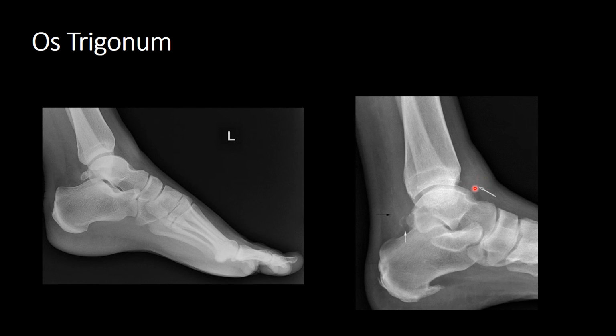This arrow is pointing to the joint of fusion anteriorly, and the black arrow is pointing to the joint of fusion posteriorly. Incidental note is of a very large calcaneal enthesophyte at the plantar fascia insertion and a smaller enthesophyte at the Achilles tendon insertion. You don't need to worry about it, it's just for your reference. Anyway, let's have a look at these 2 images more closely.